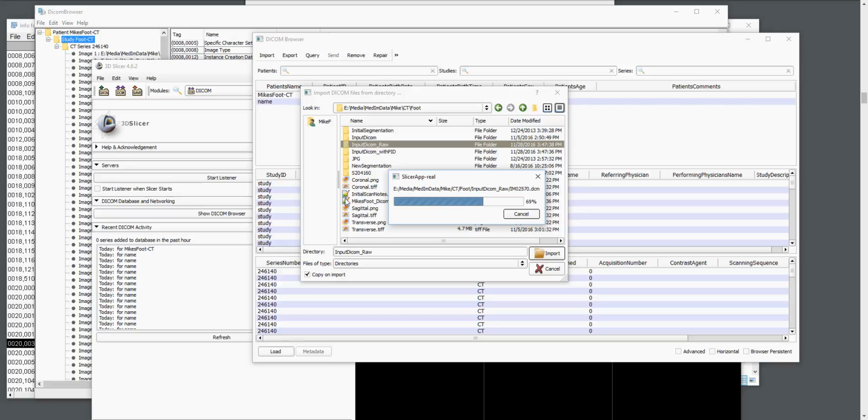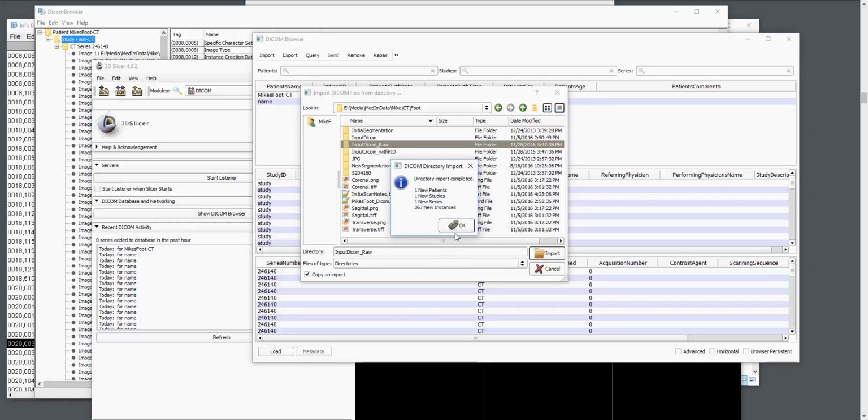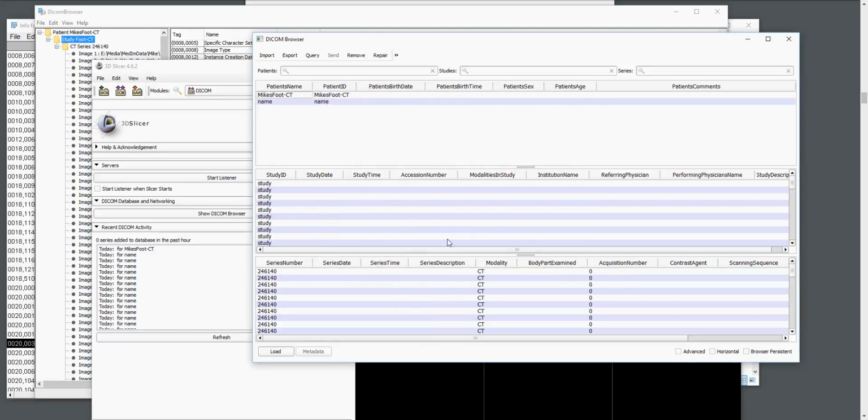Typically and traditionally, scans would be given as a folder of slices or images. Sometimes you will get a scan which is a volume, so it's one file that's, say, 30 or 40 megabytes, which is a bit better to work with. You don't have to deal with the potential of unordered slices not showing up correctly.